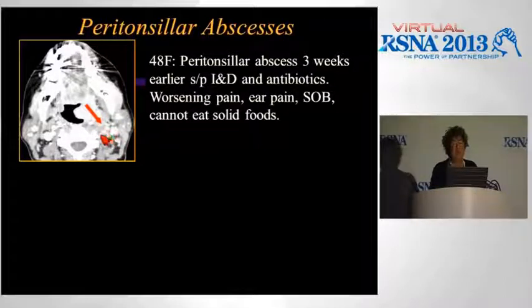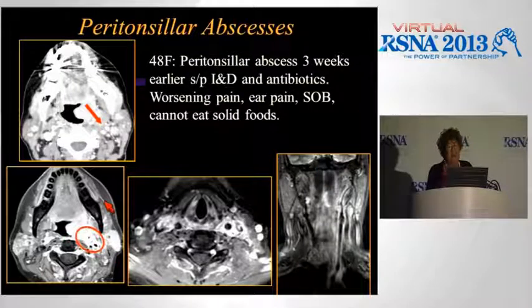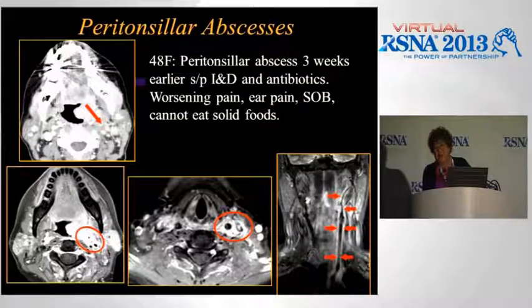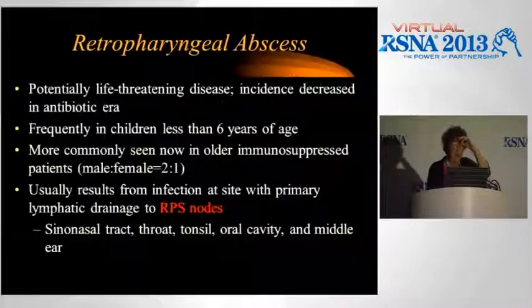The vasculature is narrowed, it's in spasm, there's edema and phlegmon around that, and if we look at the MR, you can see this has gained access to the carotid sheath. You see that there is enhancement all the way down. If you look at this coronal, this enhancement goes all the way down into the mediastinum inside the carotid sheath. So you must beware of some of these complications and be willing to follow these patients up when they're not getting any better.